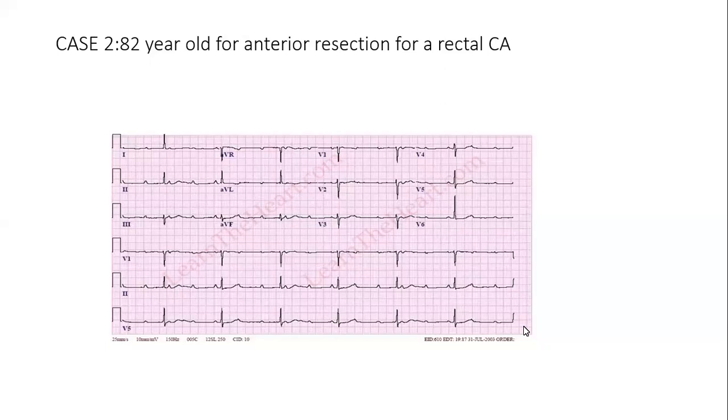Hi, Doc. Hello. So we'll start with the rate. You don't have to interpret for me, just give me your diagnosis. Oh, okay. I think it's a type 1 heart block, AV block. Okay. So it is a heart block, but let's go through it again.